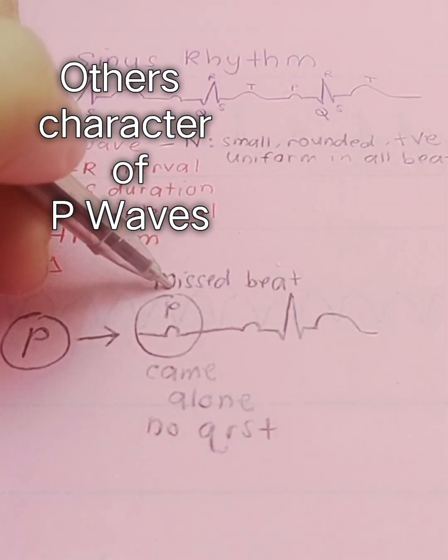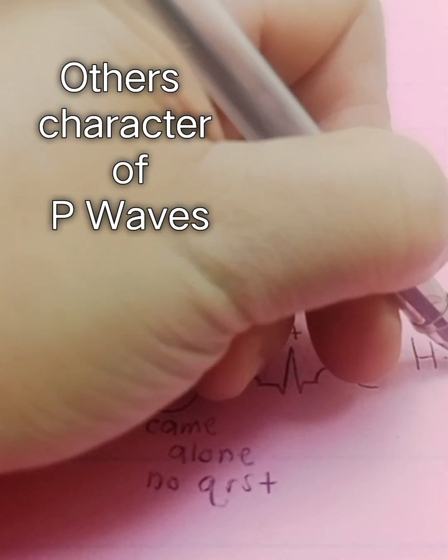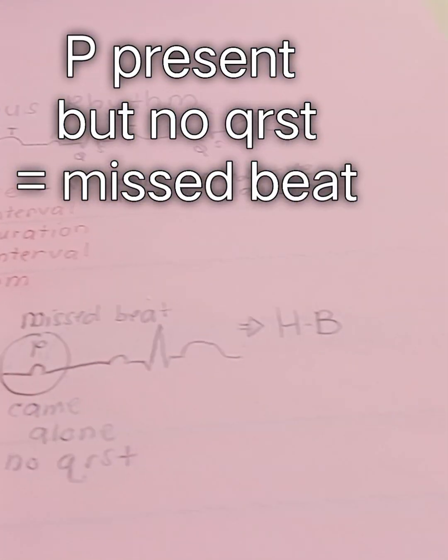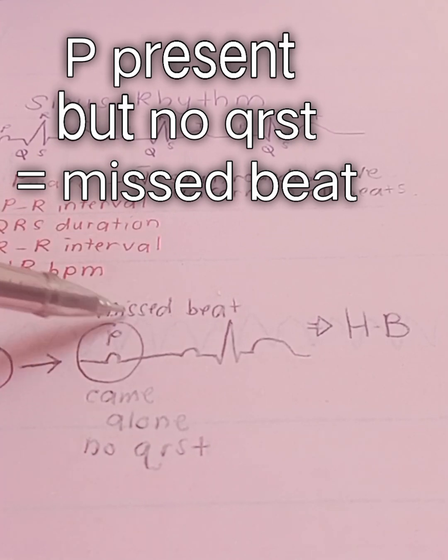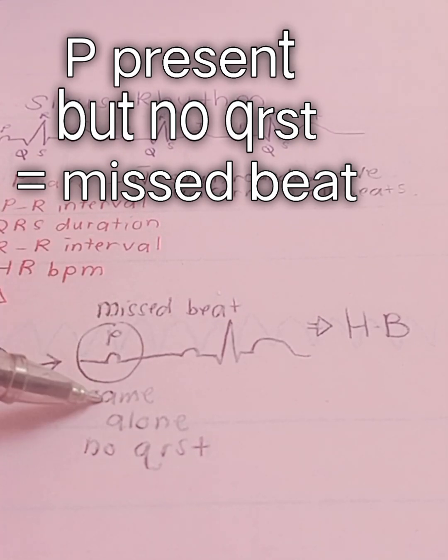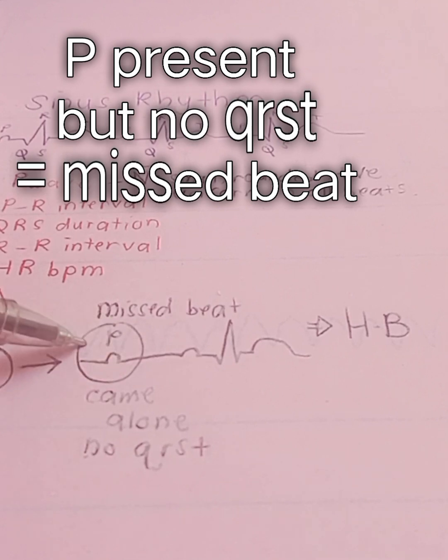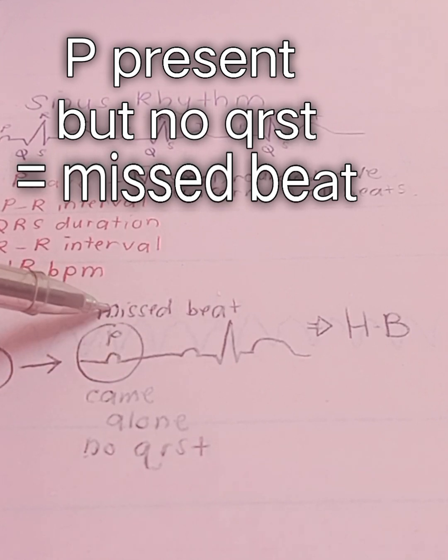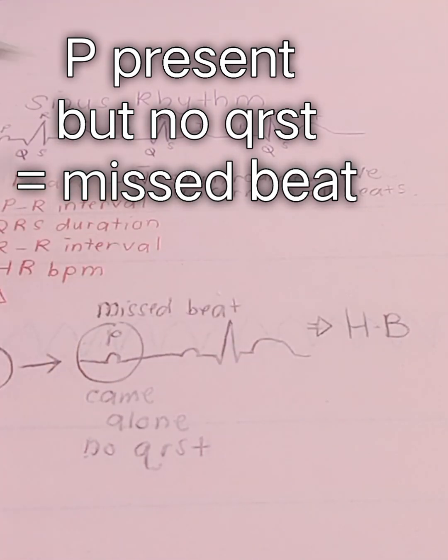If we see a missed beat, it means the rhythm is a heart block rhythm. If we see P missed beat, meaning P comes alone and no QRST, this is P missed beat. P missed beat means the rhythm that we are going to interpret is one of the heart block rhythms.